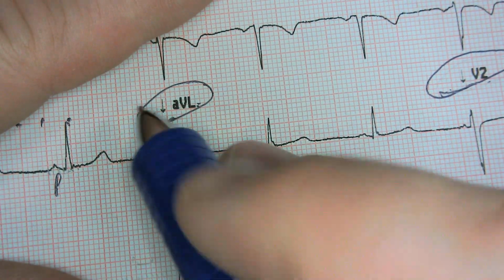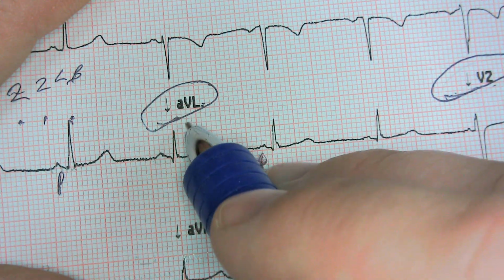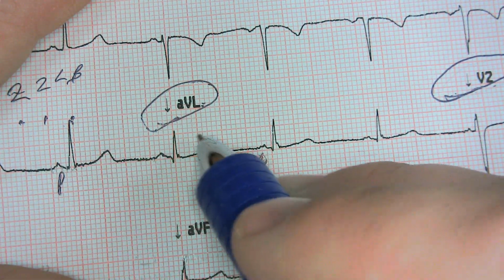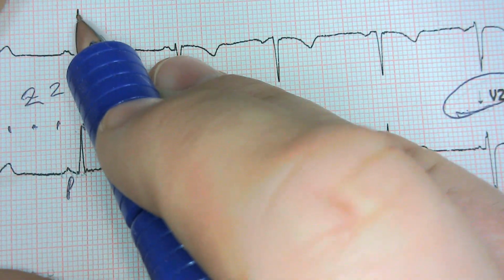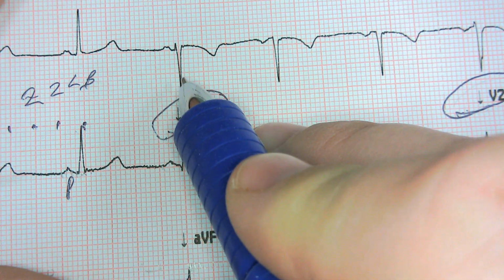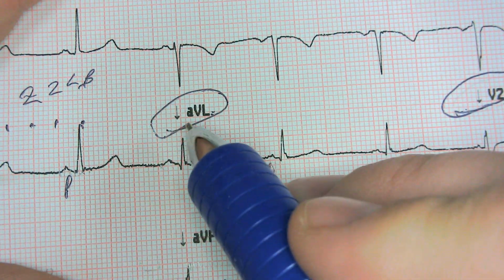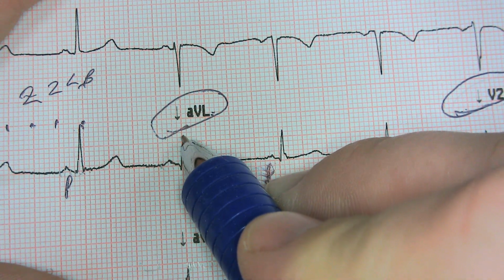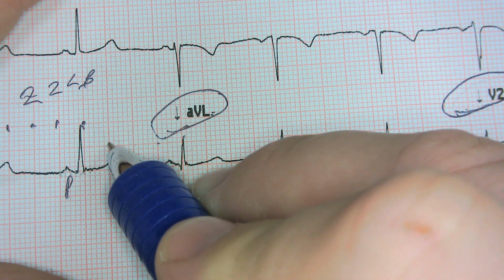Okay, so now we go over here. And unfortunately, right, this is not the same viewpoint. It makes it a little bit harder. But fortunately, we didn't do anything like this, where it gets a little bit trickier when we go from up to down. All right, so what we do is, once again, peak to peak. What a gift right here on the crossbars. So 0, haven't gone anywhere. 5, 10, 15, 20, 21.